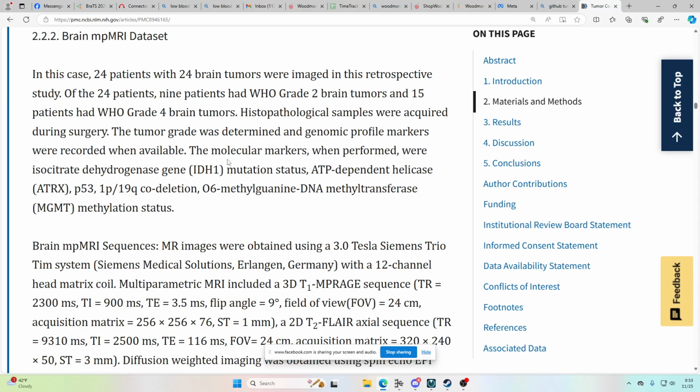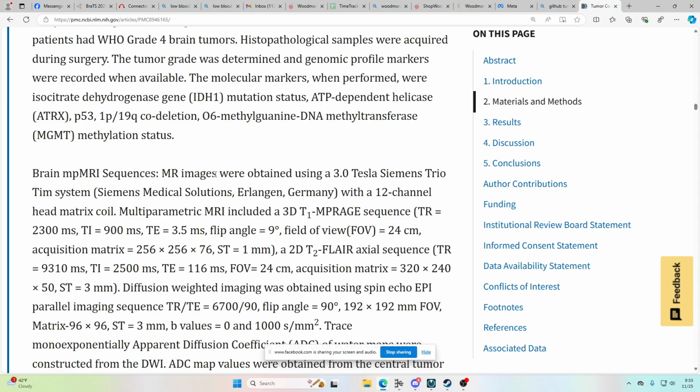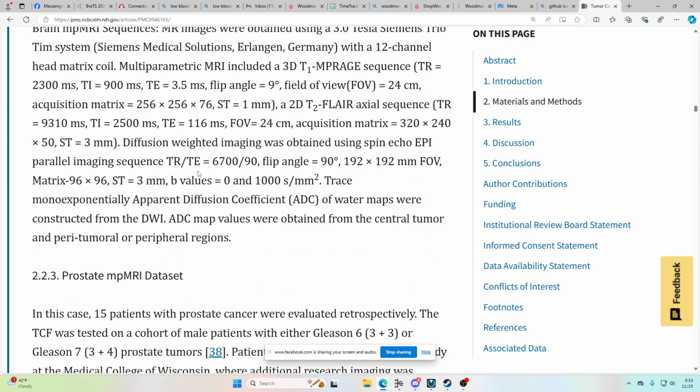This is not quite as fine grained, but it still gives different echo readings from different pulses for different types of tissue, so you can tell what kinds of cell types are in different tissues.